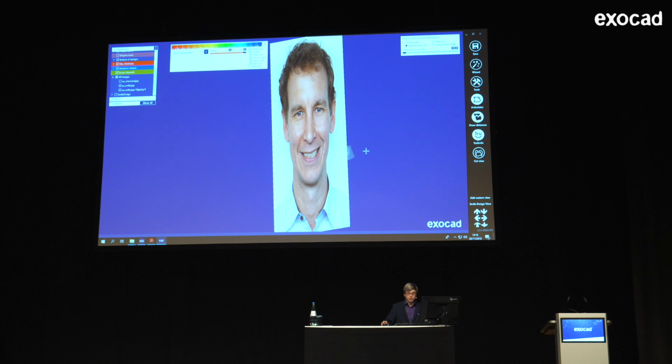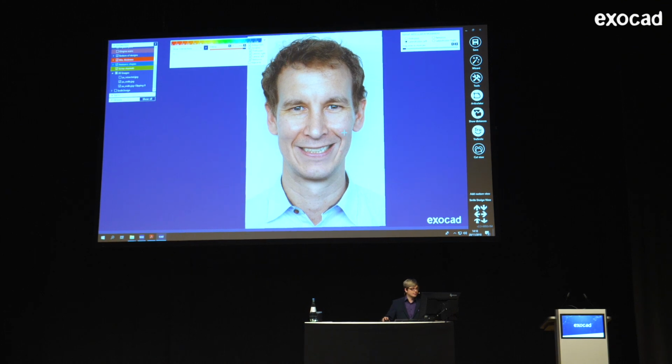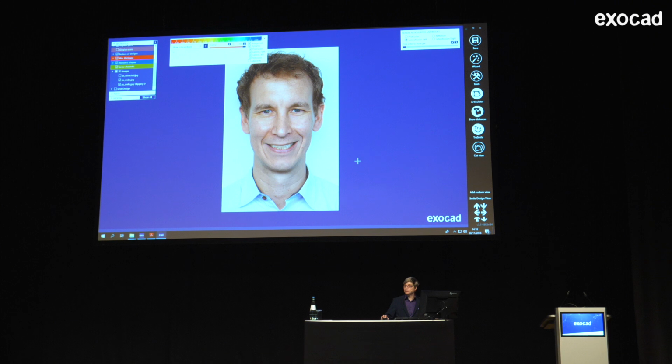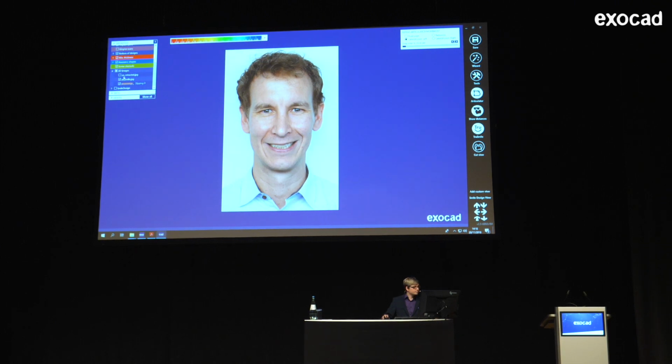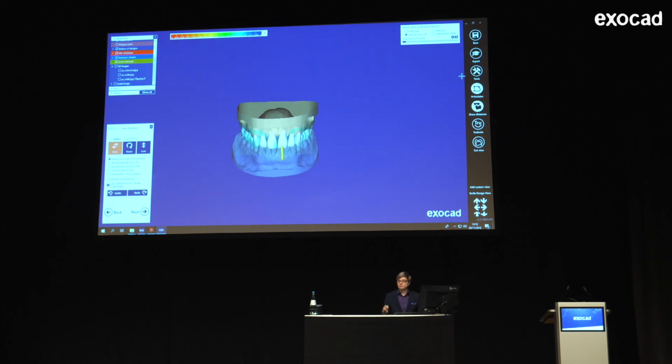But now I tilted the picture, and I get automatically here a smile design view, which sets the direction back to the view of the smile design. I can also get this view by just double-clicking on the picture itself. So, but for now, I'm hiding those pictures and deactivating the true smile, because now I'm trying to work on the abutment a little bit more.